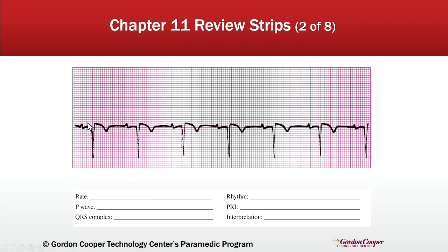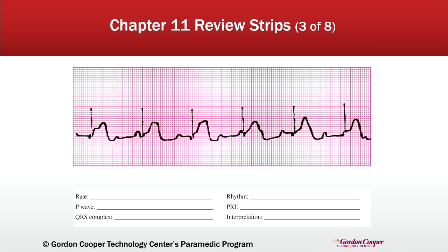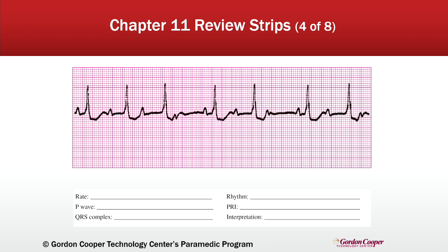When we look at this, we see P wave connected to our QRS, P wave connected to our QRS. We have a rate of 60, 70. Looks pretty regular on both sides, atrial and ventricularly. So our PR interval, though, whenever we look at this, 3, 4, 5, 6, 7 maybe. So we know that it's a lengthened PR interval. So using our little down and dirty cheat sheet thing earlier, a lengthened PR interval, first degree block. And I'll let you look at that, but let's move on to another one real quick.